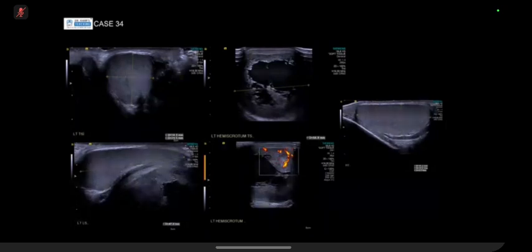Okay. So when you're ultrasounding this, you can get above this complex area. So there's no evidence of it going into the abdominal cavity. It's just within the scrotum. Okay, so it could be a congenital septated collection.